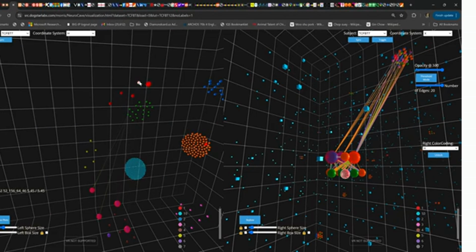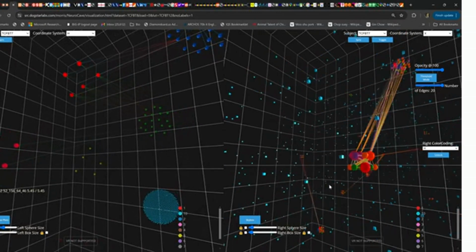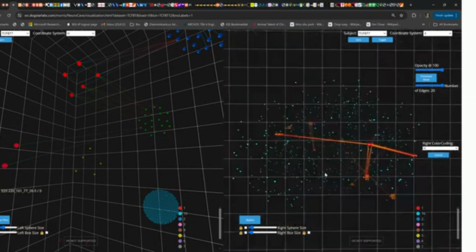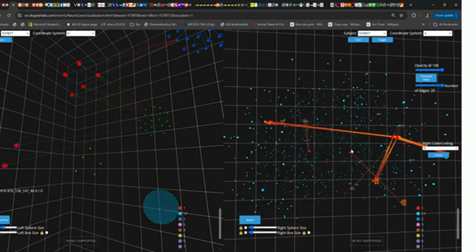And this way we can fill in the edges of this graph and compare the cluster membership view of the graph with the anatomical translation of that, and perhaps gain some insight into the progression of this glioblastoma in this individual.